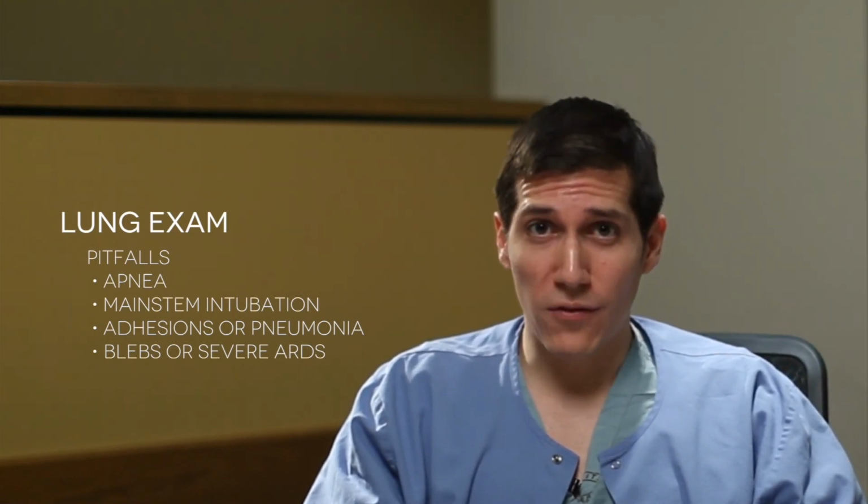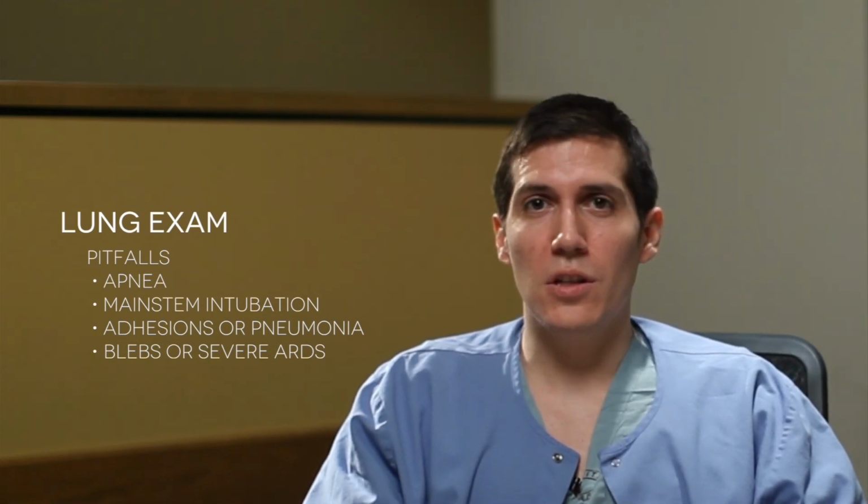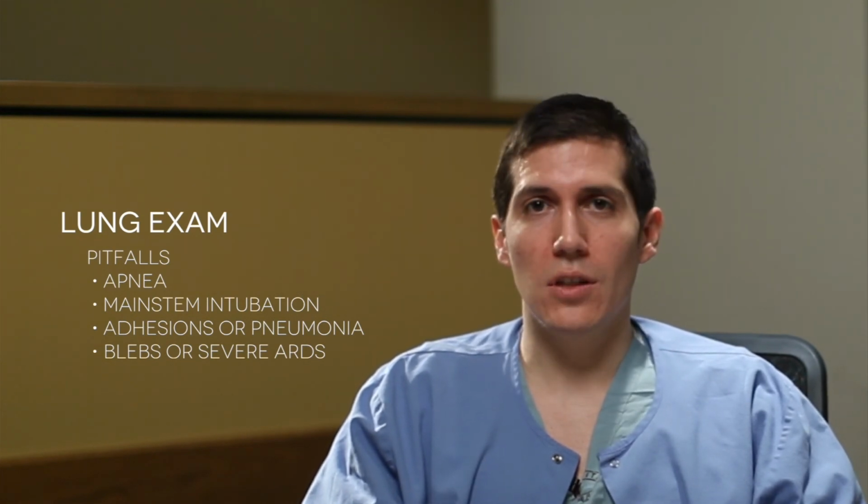So remember these pitfalls. Not everything you think is air needs a needle. That's when you need to have help with assessment and possibly other imaging modalities. So go practice. Well done.